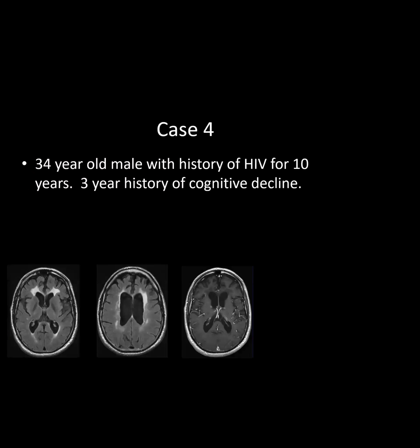All right. I showed this case last time. I'm just going to show it again to reiterate an important topic. Infections can also be a cause of cognitive decline.